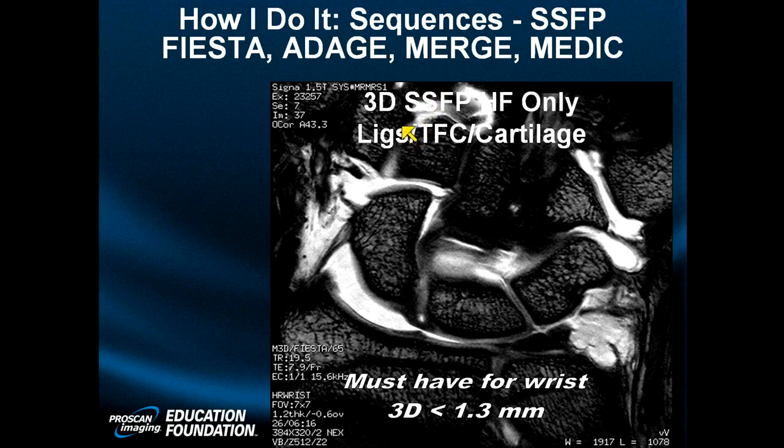I've got a nice piece of anatomy here. It's a coronal. I love the coronal. It's an arthrogram, and it demonstrates not so much the anatomy, even though the anatomy is gorgeous, but the technique. The in-plane resolution is awesome. Right? The field of view is 7, ideal.